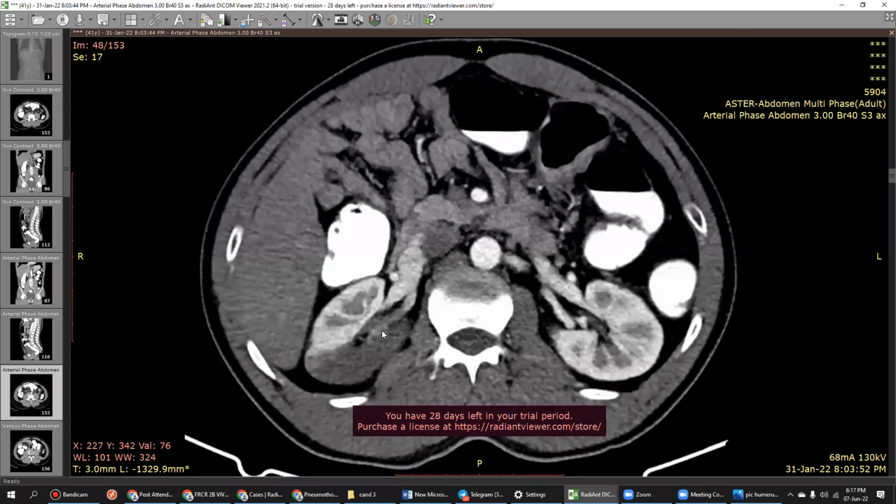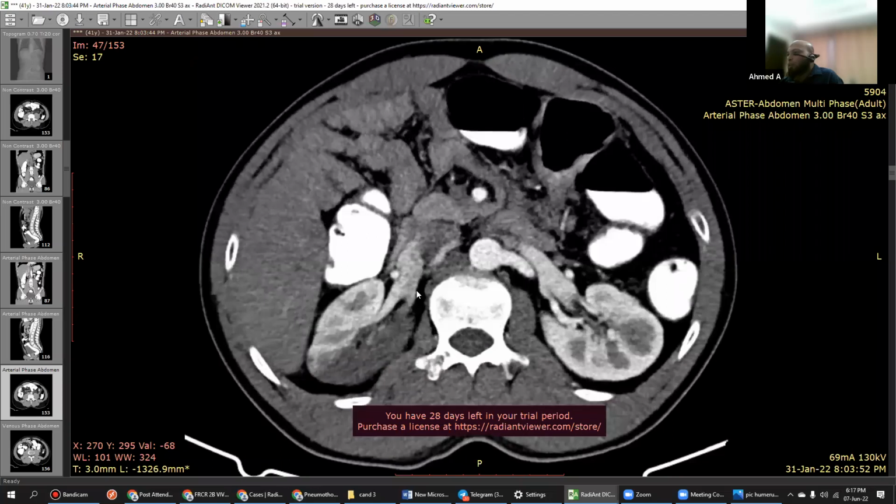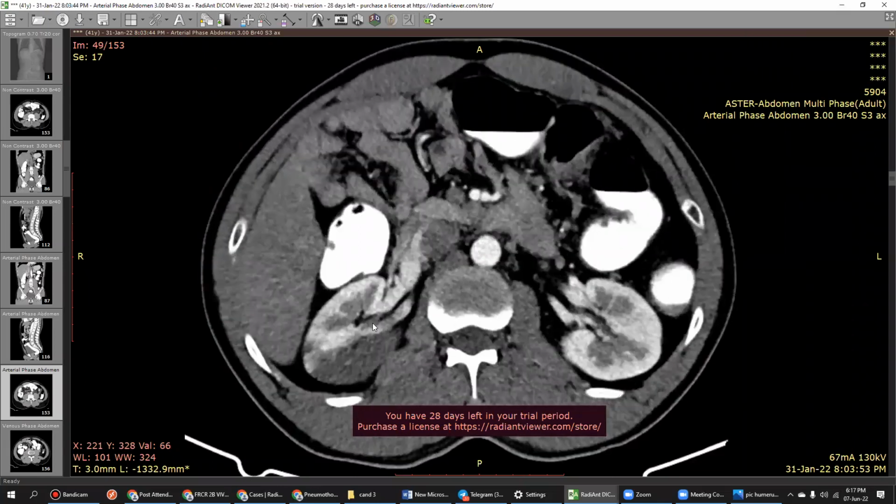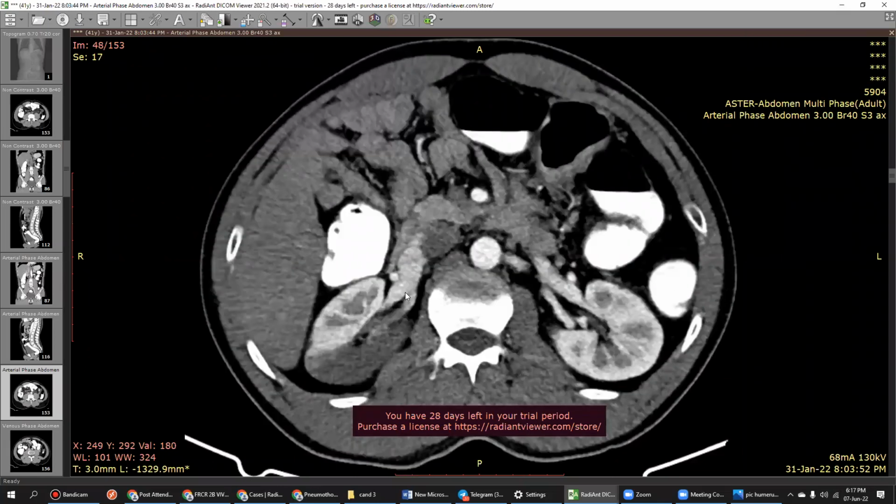I get confused about whether it may be venous or arterial. So always we need to follow it up. This is the vein. You can see this is the vein. This is fine. You can see this one, right? Yeah, because this is the anterior segment.